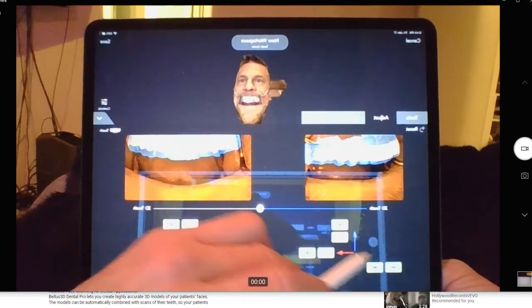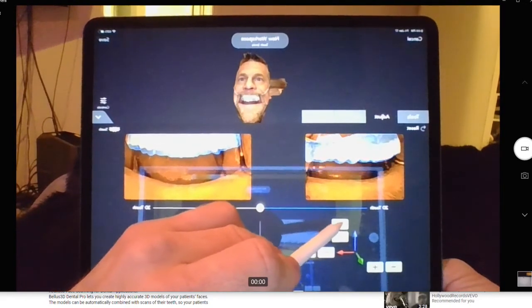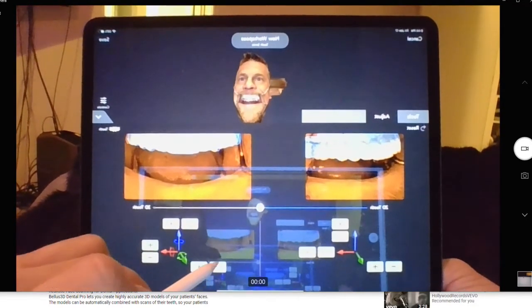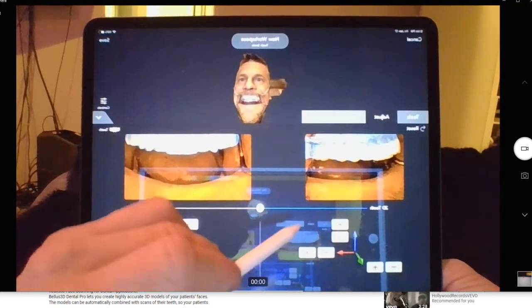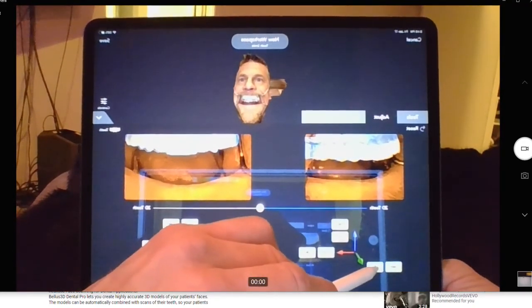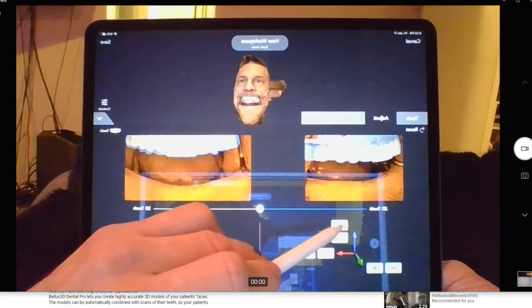That's usually one of the trickier things. Now that I've done that, I can see I've got some other ones that weren't as close as I thought. I'll have a better way to do this shortly, but it's starting to look pretty good. So a lot of times the forward one is the one you're missing and you don't know.